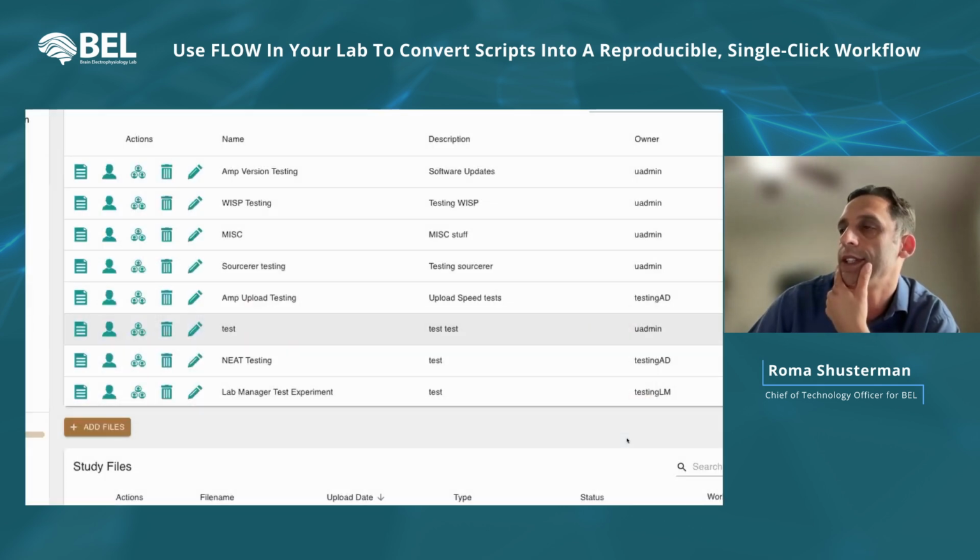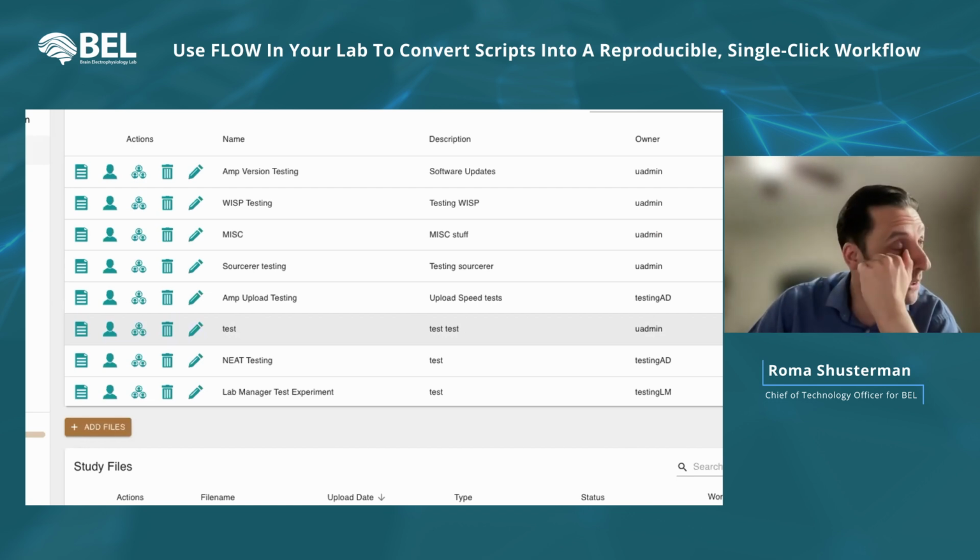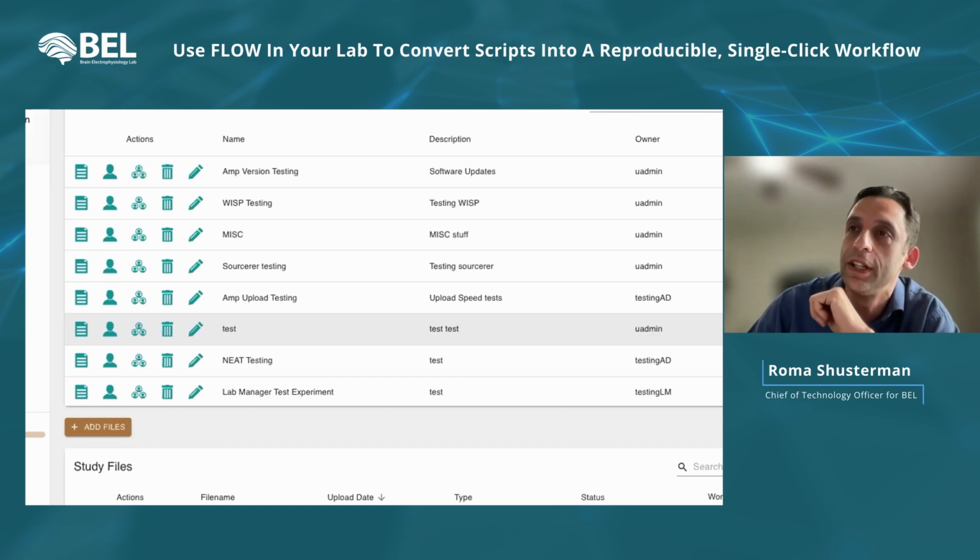And then I can start execution. So the workflow starts right now, and takes about 8 minutes. Again, this is a specific workflow with all the analysis we just heard in the first part of this webinar.